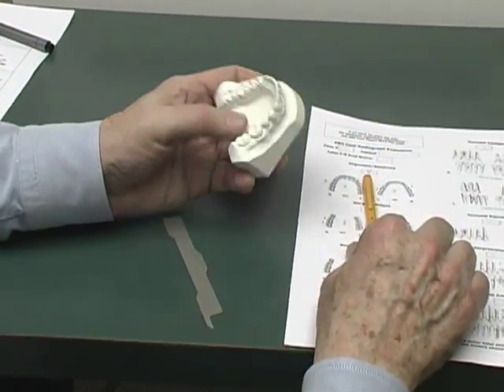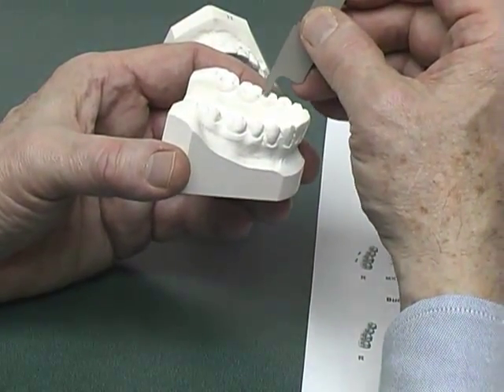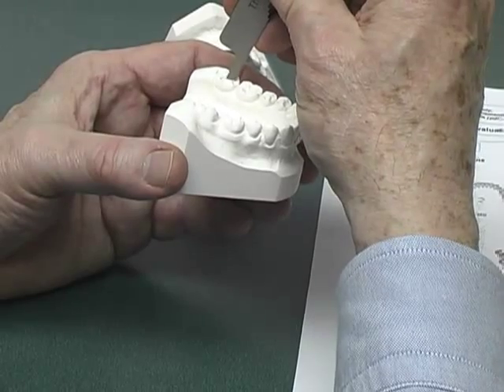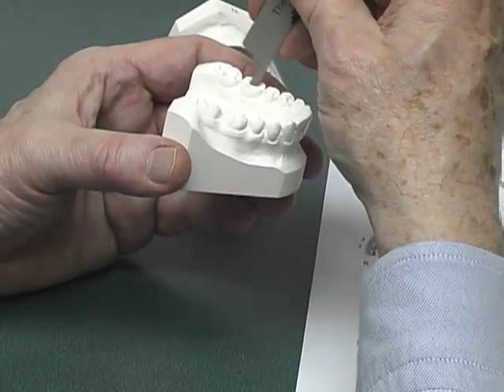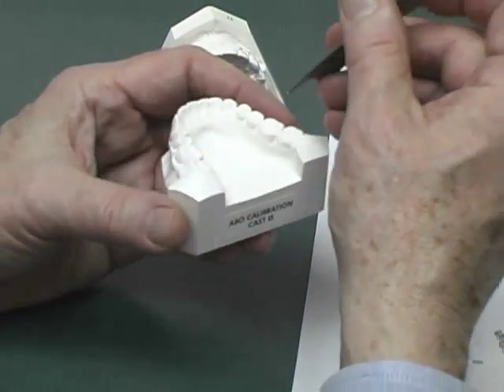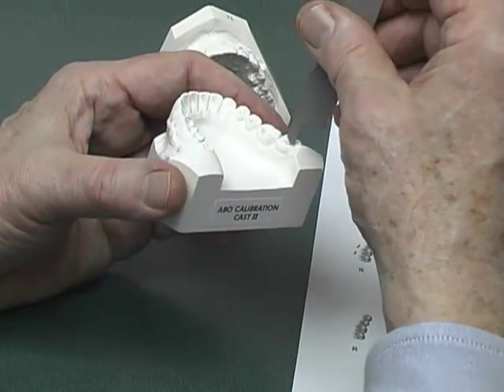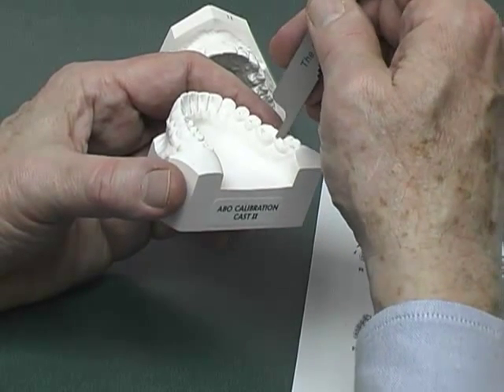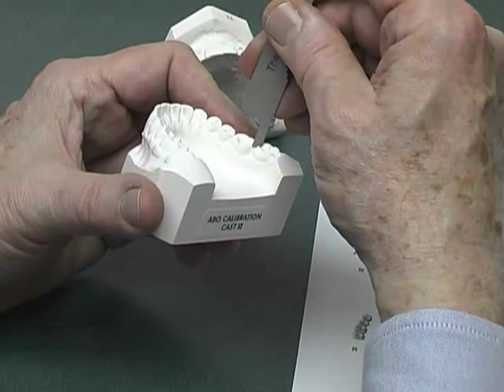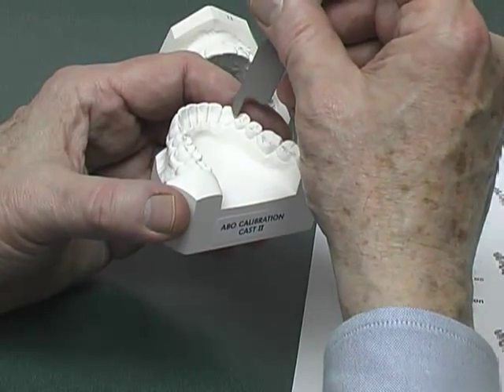Now if we move to the mandibular cast, I sweep over the marginal ridges on the left, mesial to distal, distal to mesial, and I detect nothing. Move to the right side, mesial to distal, looks like a bump there. So a distinct bump with the marginal ridge of the second molar that is less than a millimeter, so 1 point. Nothing measured in the other direction though.